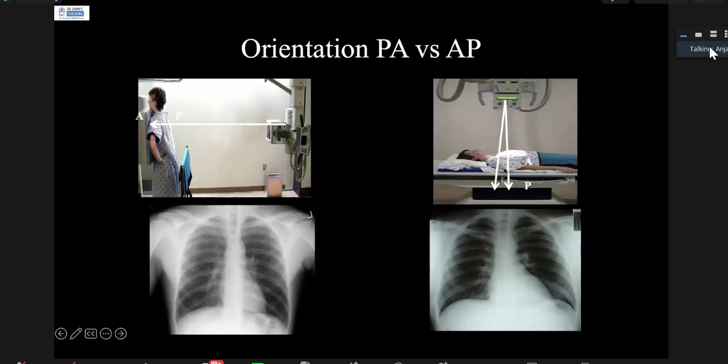So once the X-rays come out of the patient's body, they are diverging a little while they traverse that short distance. In effect, they are causing some magnification of the heart and mediastinum because of that distance. So this is why an AP X-ray has an inherent magnification of heart and mediastinum.